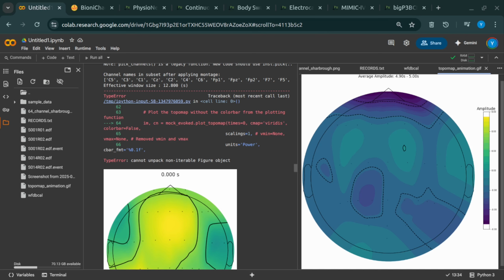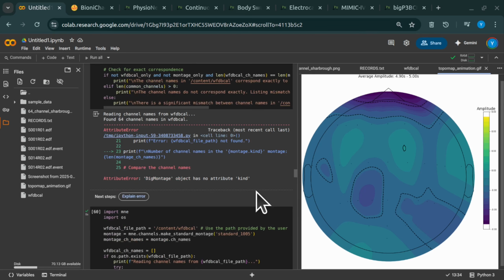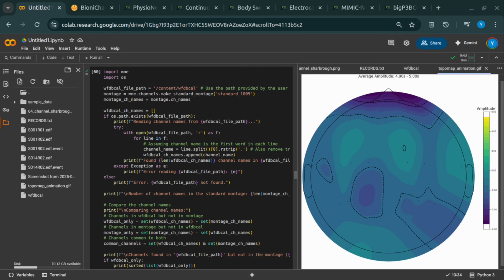That threshold is there to automatically reject epochs contaminated by large artifacts, things that aren't brain activity, like eye blinks or jaw clenches or muscle tension. These create much bigger electrical signals. So basically, even though you fixed the timing, the data in that specific window on those specific channels was just too noisy, likely due to muscle activity or something. That's the idea. Our electrodes picked up loud non-brain noise right at that T0 moment.